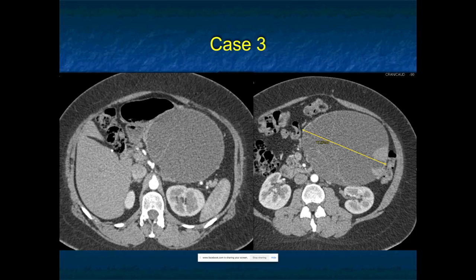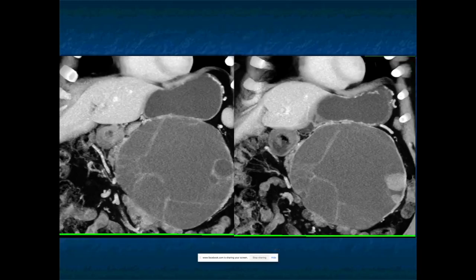Serous may be, it's not a pseudocyst, it's not an IPMN. Look at those septations now. Sometimes I see the septations best in the coronal, so you got to look at the coronal views as well. So now you have a cystic lesion, body and tail of pancreas, large septations.